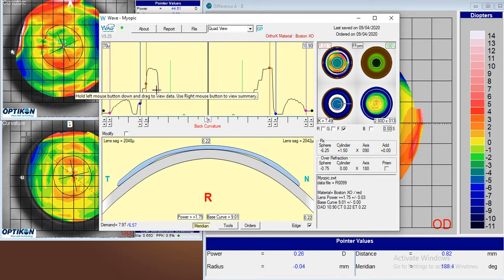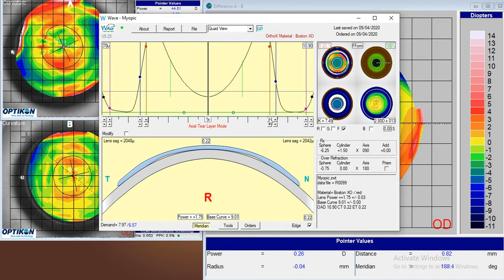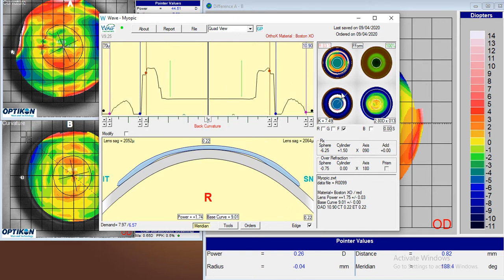And so if we start with something like this, we sometimes will get a weird number at the end. I know that I click down about 8 to 9 clicks, and I know that will result in a 7 to 8 micron increase in sag at this point. The other thing to do is just to find a starting point where we don't have this step.